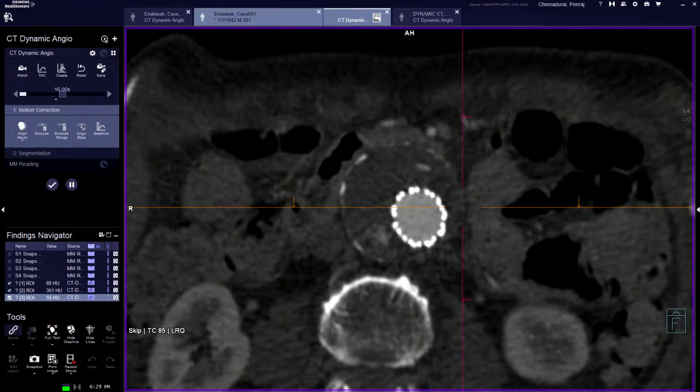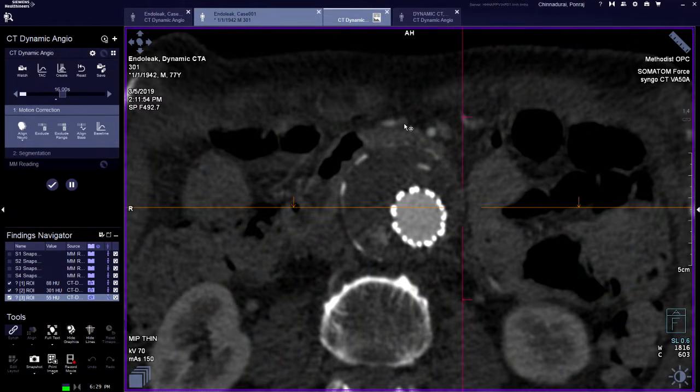Here... I mean, the reality is it's a pretty big deal to go back in and redilate the neck. Yep. It's tough, because now you've got to cannulate both renal arteries. You've got to protect them so you don't squash them when you put the balloon in there. Okay. So that's very helpful.